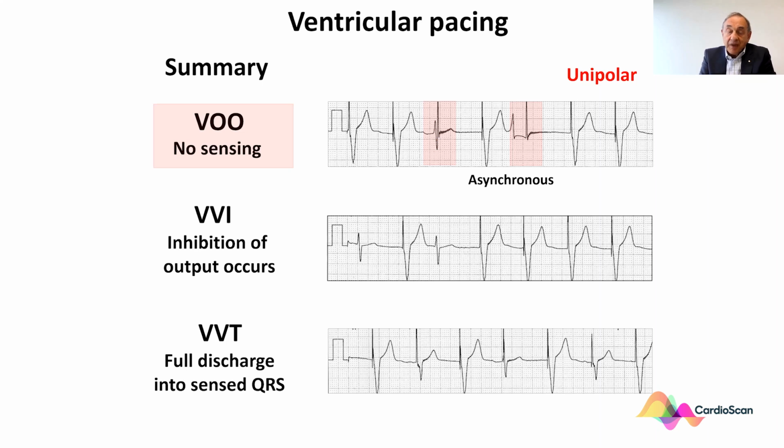during those beats. The second form means that there is now sensing of any native QRS complexes. Once again, we can see what appears to be a sinus beat, and there is a sensing of this. So the sinus beat, red highlight, and then there is a cycling period, and as there are no further native QRSs, the next pace beat occurs, as shown by the red arrow.